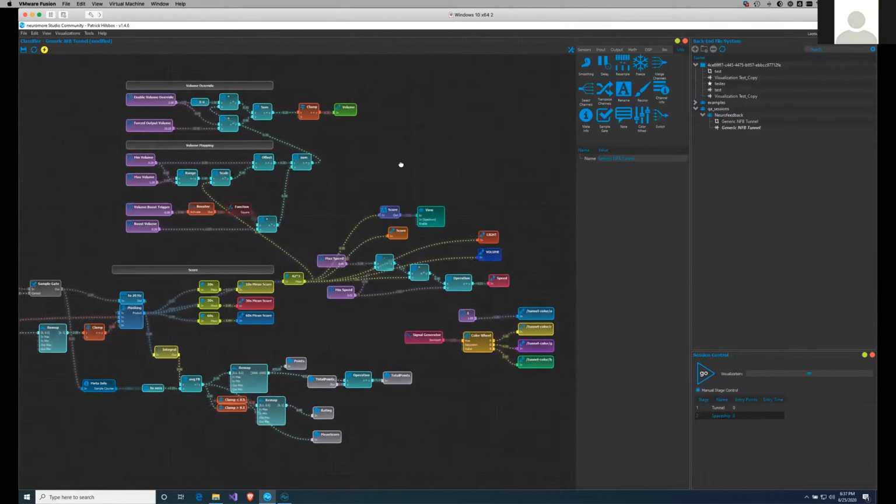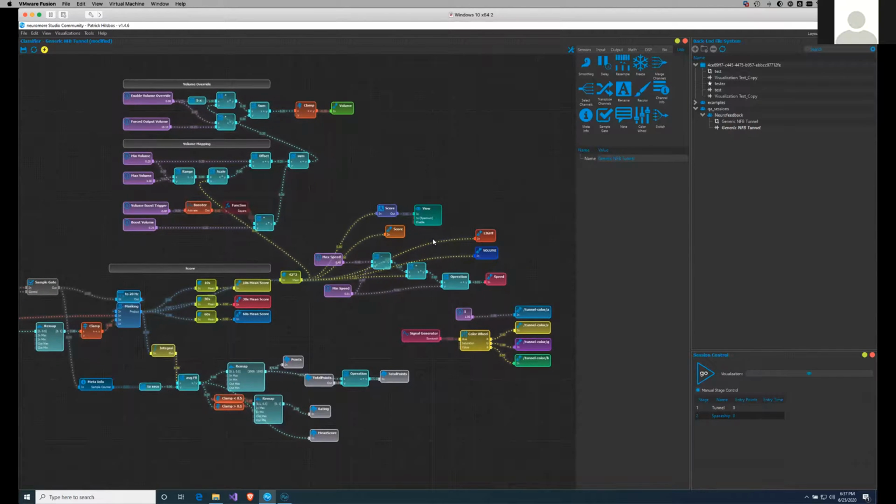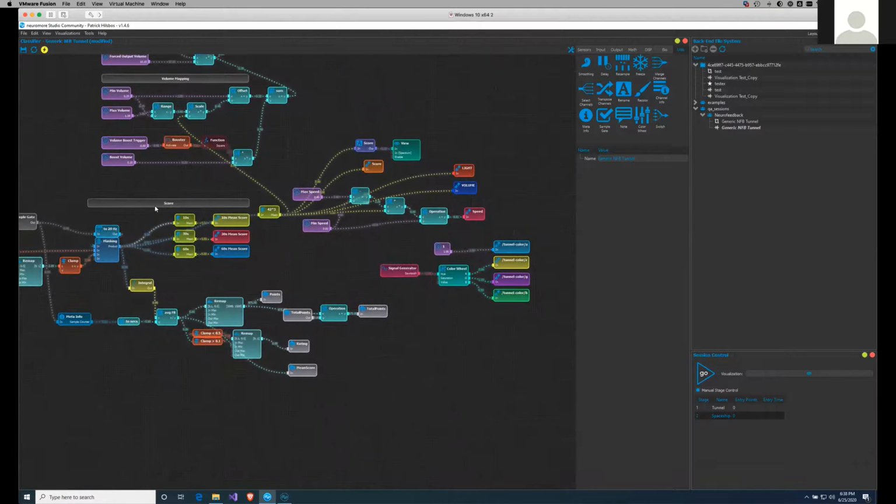All that then feeds into particular outputs that are being calculated. That particular classifier, on the one hand, takes care of volume. It's capable of controlling the volume that comes out of the studio to give real-time feedback. There's also a bunch of parameters available: override volume, minimum volume, maximum volume, and so on. If interested, please ask. If not, you can just play around with it. And then there's a score being calculated. Score is how well someone is currently doing.